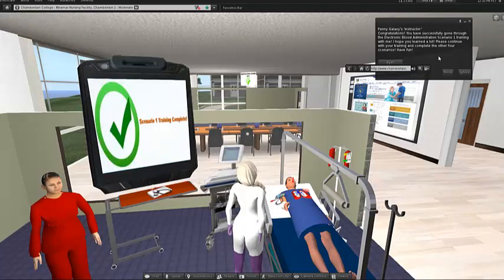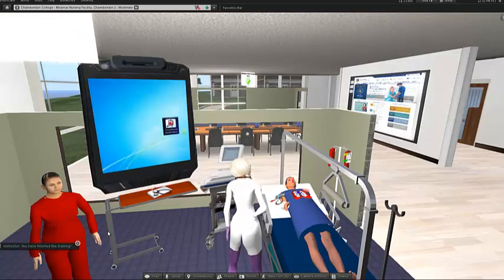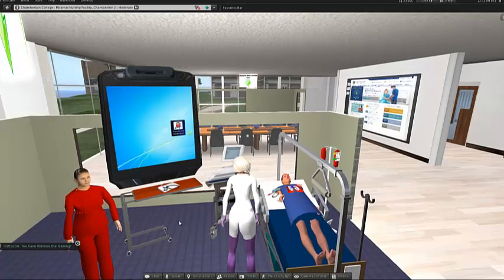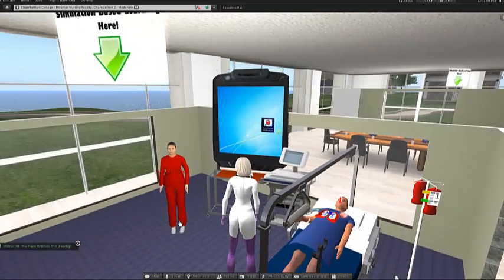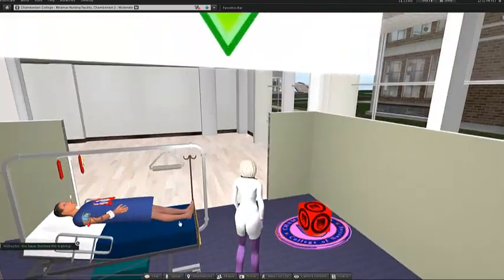I'm now told, congratulations, I have gone through the electronic blood administration scenario 1 training. I am asked to complete the other 4 scenarios, which is in the simulation. I click on buy. I'm told that I have finished the training. The screen goes back to the beginning screen, and the nurse goes back to click me to start. I have completed the electronic blood administration simulation scenario 1. I can now go back out of this area.